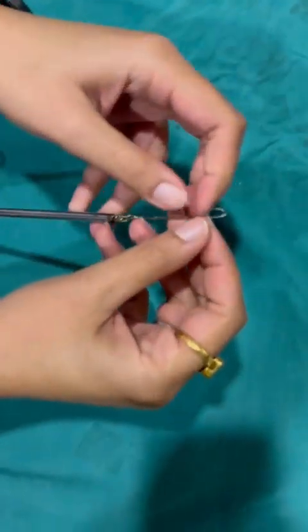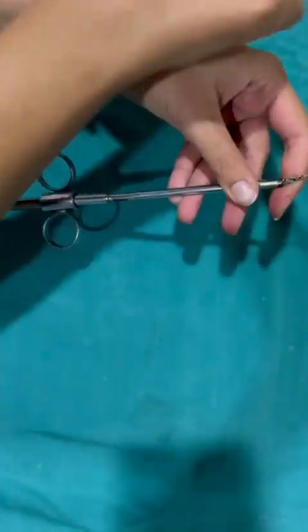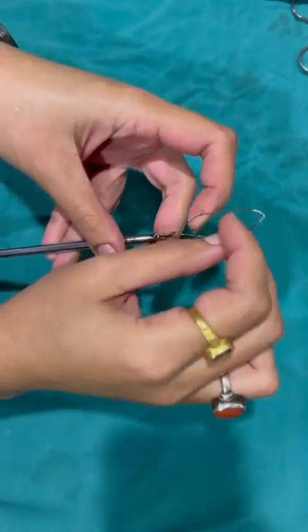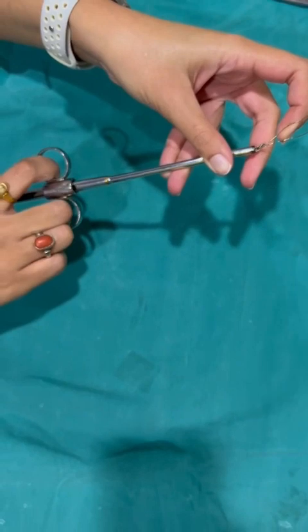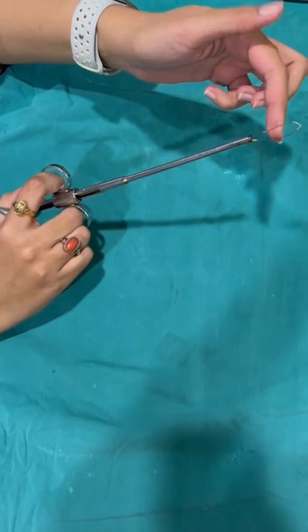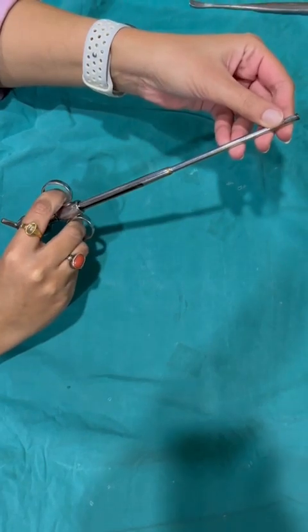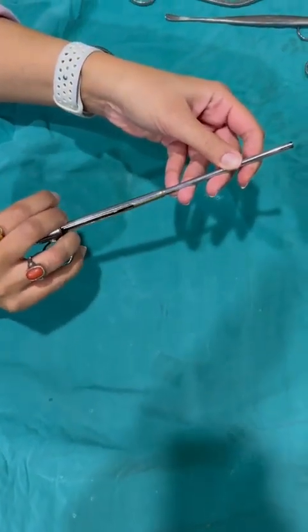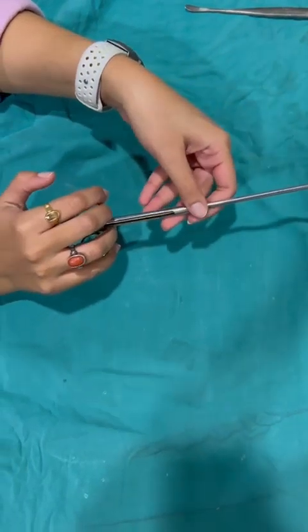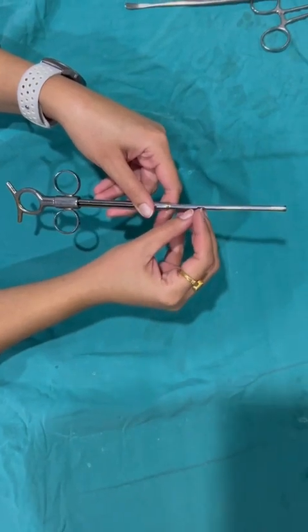After dissecting the tonsil from the tonsillar bed, only when the stalk of the tonsil is left, we introduce this snare inside the oral cavity. We pull the tonsil out through this ring. Then gently we close this instrument in order to reduce the circumference of this wire, and then we hold it at the stalk of the tonsil. Then we gently crush the tonsil and push it like this to separate the tonsil from the tonsillar bed. This method of coagulation will release the tissue thromboplastin factor, which is useful for the coagulation cascade in order to prevent bleeding.